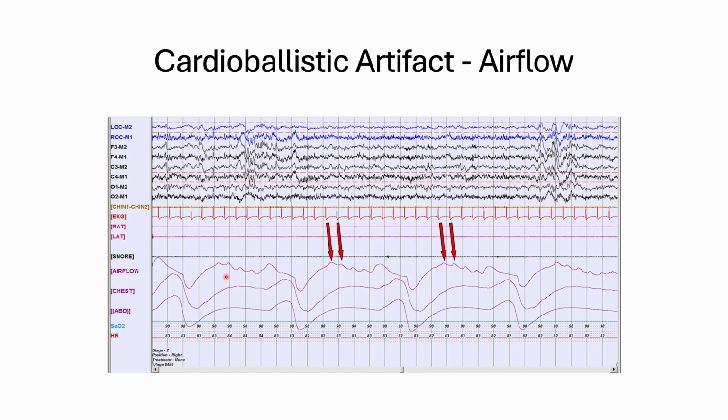Cardioballistic artifact is not really something you can get rid of. You just need to know this is normal. This isn't like them trying to take tiny breaths or anything like that. That's just something that happens.